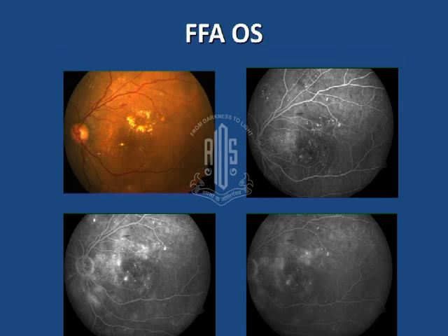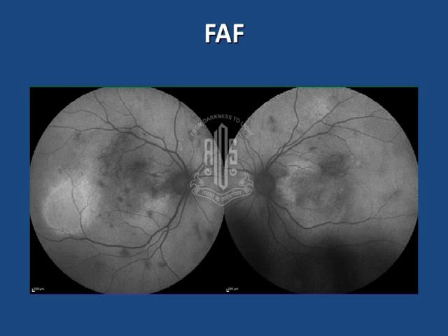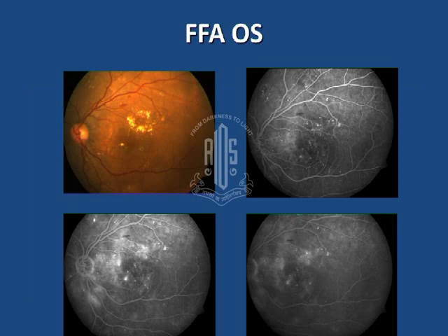This is the left eye. Another NPDR case, NPDR with CSME. But OCT showed a lot of fluid in the macula in the left eye, serous macular detachment. The right eye has more of spongiform edema, little serous macular detachment, but the left eye, a lot of fluid. Then we did a fundus autofluorescence, and we saw a hyperautofluorescent area along the macula, temporal to the macula, inferior, here also. This has an underlying central serous chorioretinopathy also. That could be the cause for the large serous macular detachment.